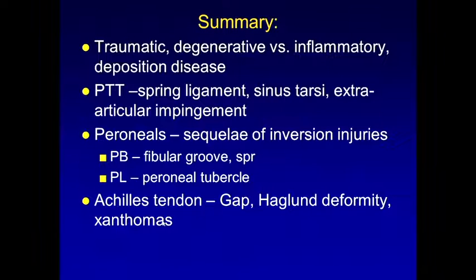So finally, in summary, I've talked about traumatic, degenerative versus inflammatory changes in a tendon. Keep in mind, you can even have deposition disease. We talked about the posterior tibial tendon. Look for spring ligament pathology, sinus tarsi syndrome, and extra-articular impingement. When you're looking at the peroneals, look at sequela of inversion injuries.